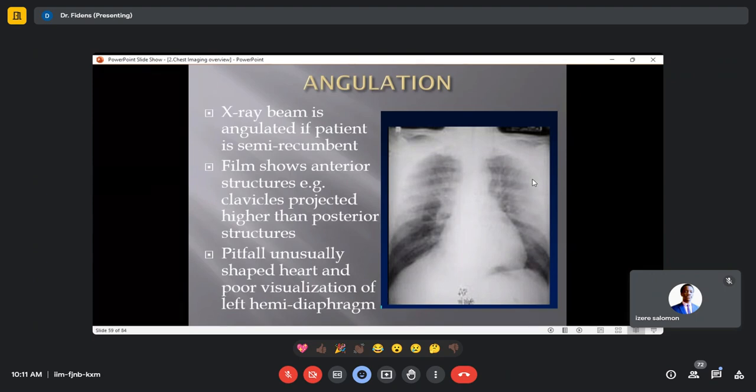Normally, that physics is for residents in radiology, because there is what you call the anode heel effect. The anode heel effect is also caused by angulation, but that is happening in the machine itself. It can even cause this kind of asymmetry in opacities in appearance. Okay.